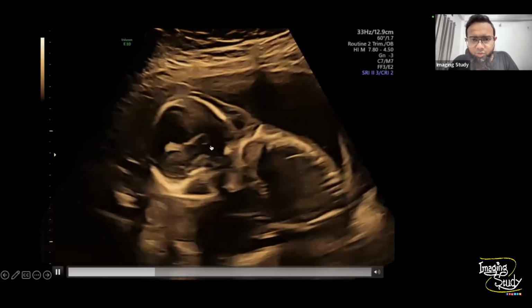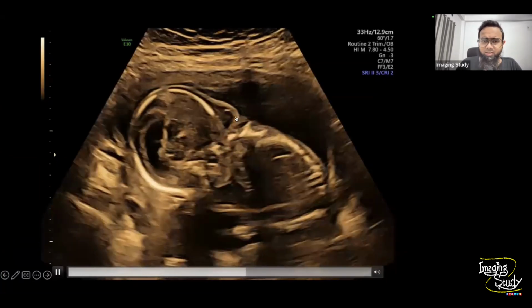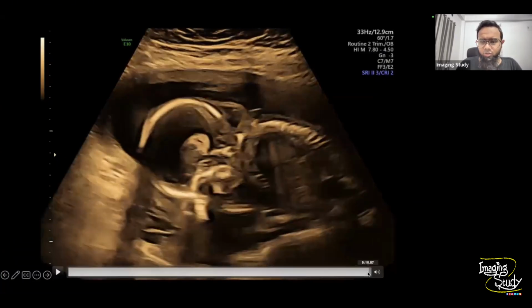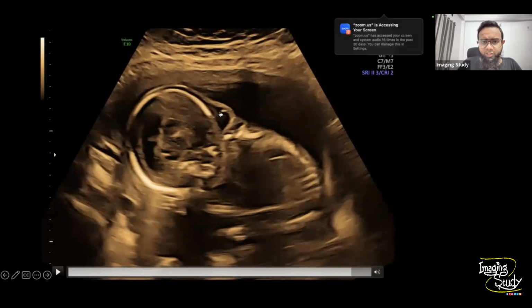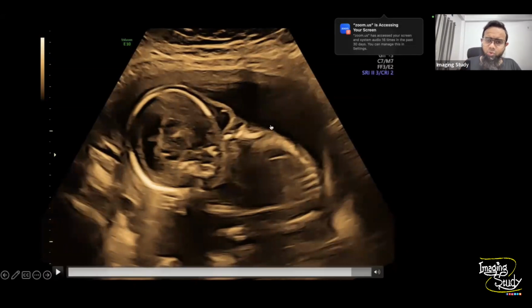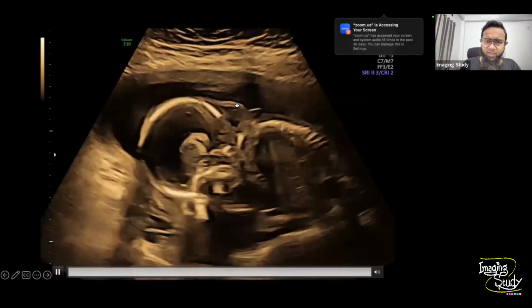Oh, what was that? You can see some cystic area at the back of the neck. So this is the cystic hygroma in this patient. Why is it cystic hygroma? Why is it not an encephalocele or something like that? You see some thin septation here. This tiny thin septation. Whenever you see a cystic space at the neck, just below the skin, outside the bony area, there is no bony defect here, and you see some internal septation, you go for the cystic hygroma. So this is a very common finding.